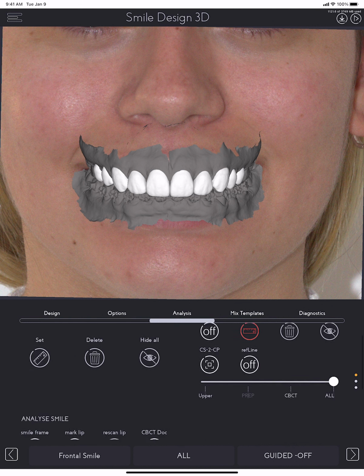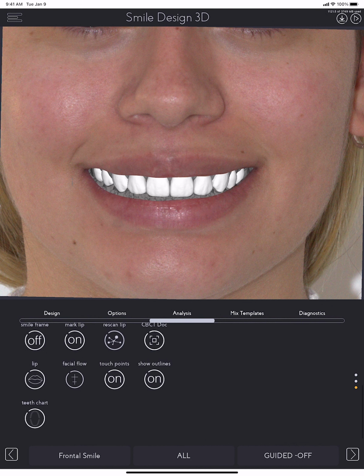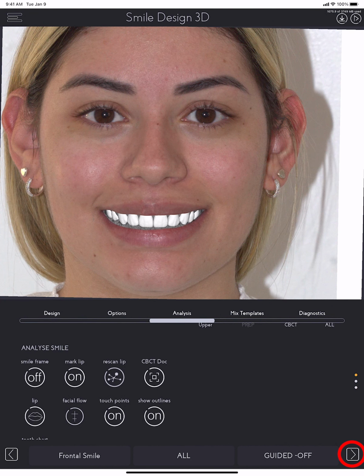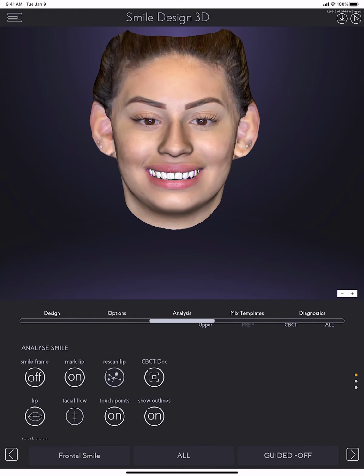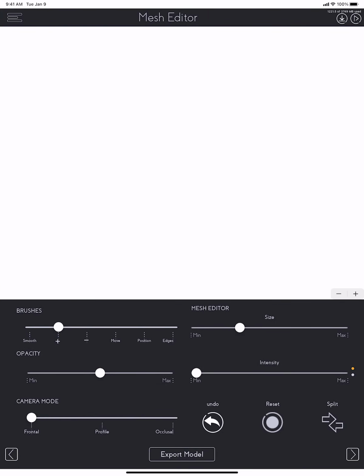just as before, you can always simulate the design to then tap on next to do some final adjustments and export the model to 3D print. To do the final adjustments, make sure to tap on Mesh Editor and select Solid Templates.